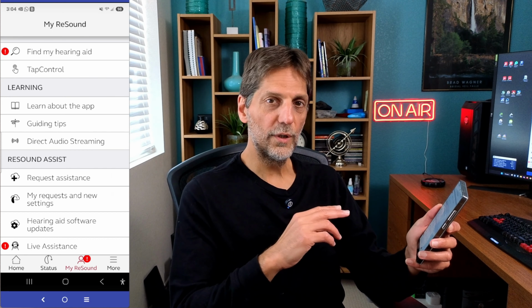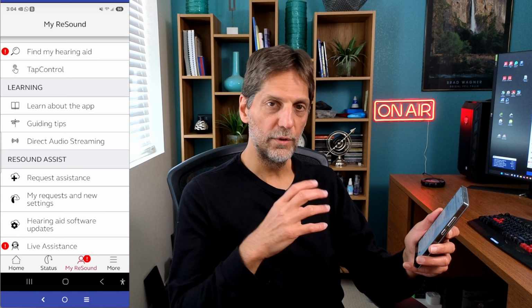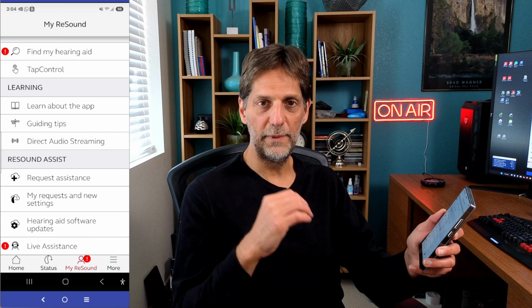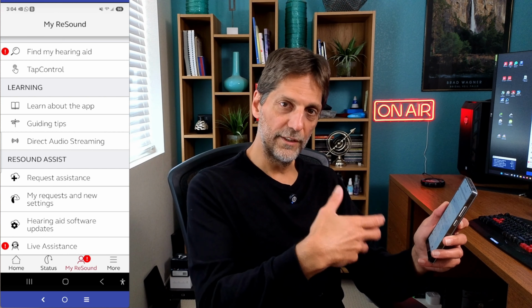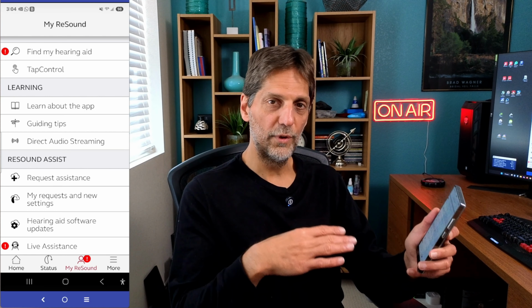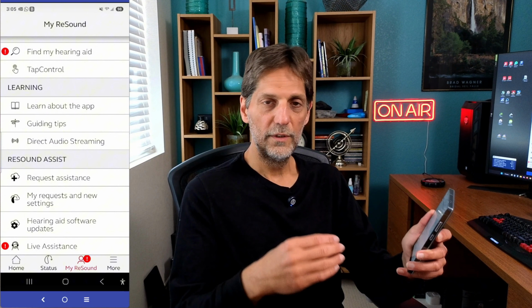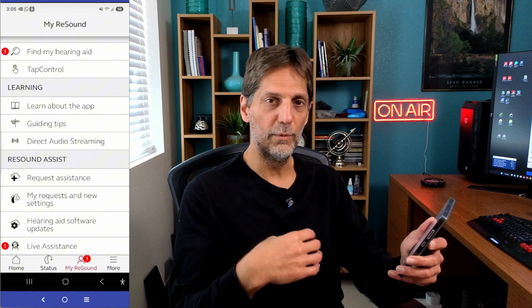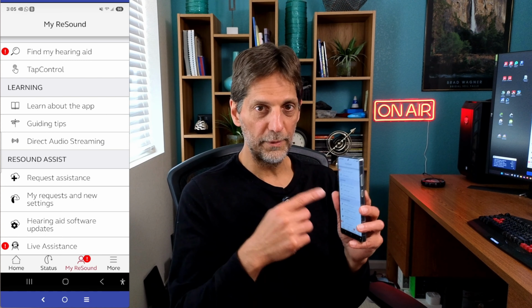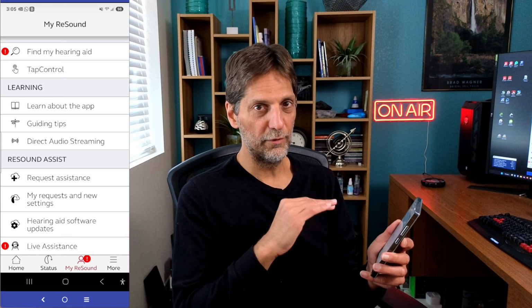Now, the next thing I'm going to show you may not be available for all the hearing aids. The request assistance will allow you to request specific changes based on your feedback, and then your request is going to be submitted to your audiologist. They will make the changes and they will send them to you via the app. This means that you do not have to have a live meeting, so if schedules are a problem, you overcome that issue. You can just describe exactly what you need, what your problems are, your audiologist will make the changes and send them to your application and to your hearing aids. This is just an amazing feature that I think all manufacturers should adopt.